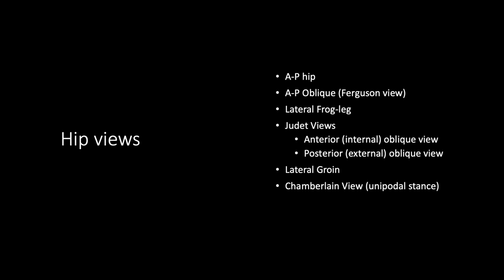For the hip views, we're going to be primarily looking at the AP, and we can also use the oblique views as well. So you see all the different types of views here, and the lateral view as well.